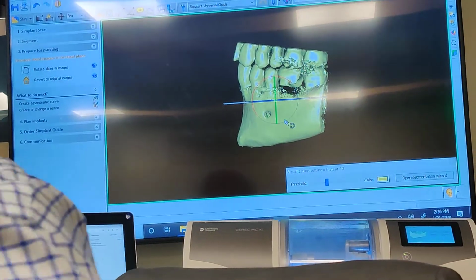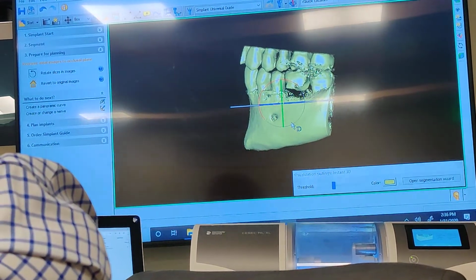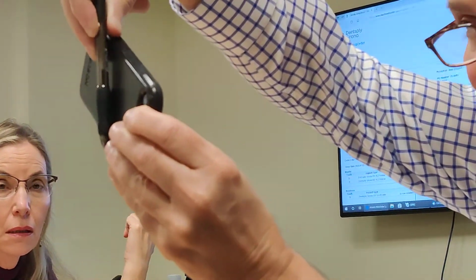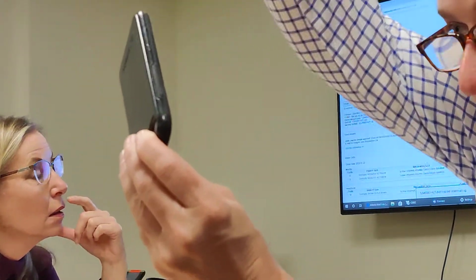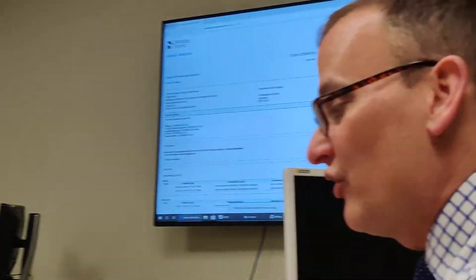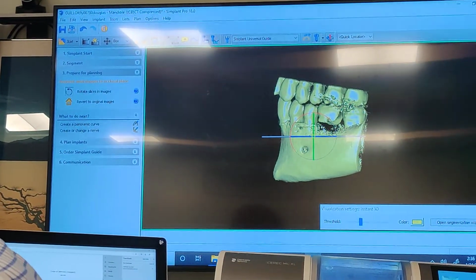And it's important that if I took, okay, here's the jaw. And I'm planting my implant like this. Wait, residents, look at this. I'm planting my implant like this. I've got to make sure that I'm cutting through the ridge like this. But if my ridge is like that, you see how I'm getting bad data. It's going to say I have more bone height than what I really have, because I'm going to put the implant in like this, not like that. So I've got to make sure that I'm correctly positioned how my implant's going to go, okay?